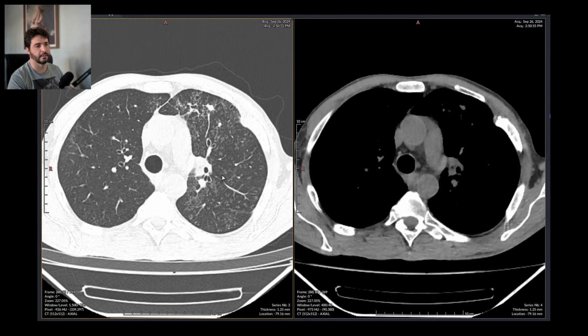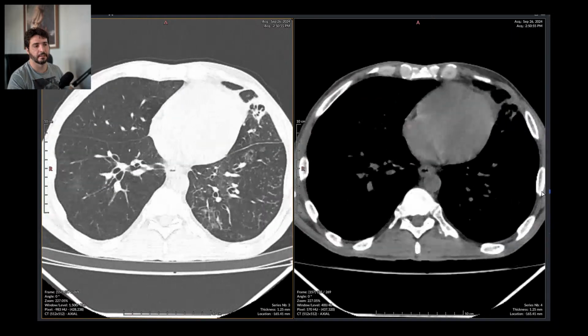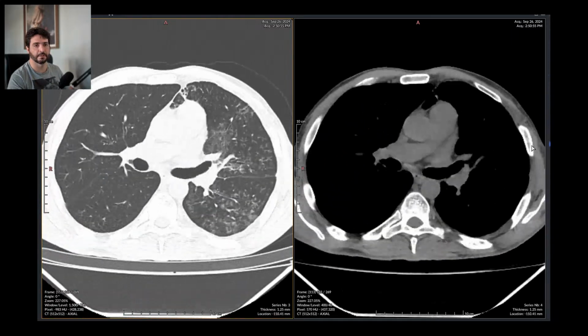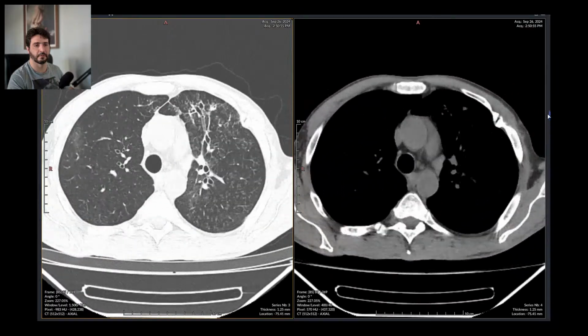Yeah, for a 42-year-old male, this is a very bad sign. He is going to have a bunch of residual disease for sure.